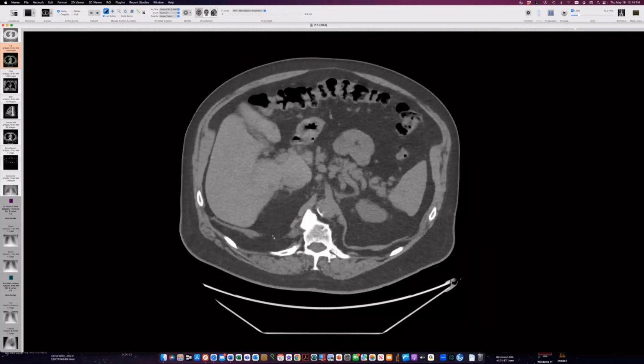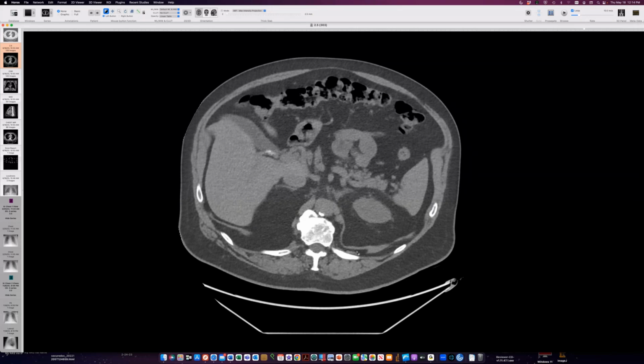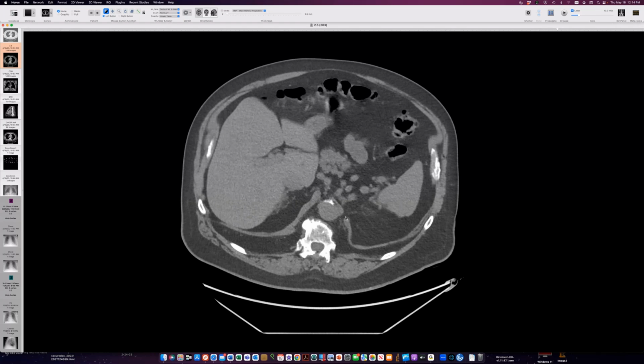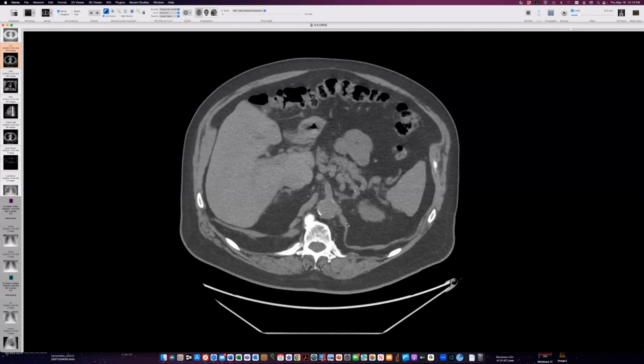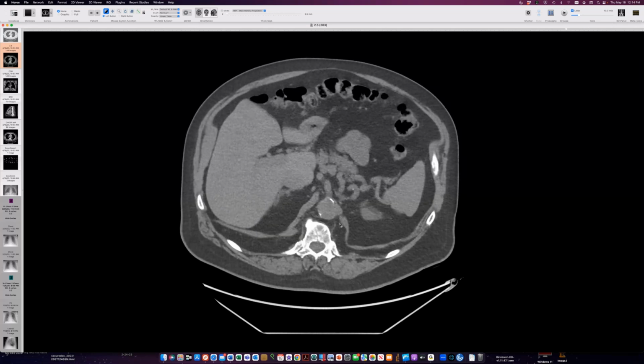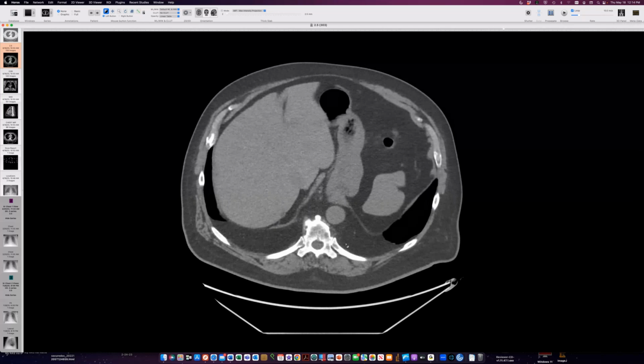You can see the discontinuity in the posterior hemidiaphragm here, and fat has emerged. And I presume that it has ruptured through the parietal pleura on top of the diaphragm on the thoracic side. It's probably just popped through and it's now oozed out, and it's probably free in the pleural space. And that's happened on both sides. The defect on this side is much smaller. It's medial here, very small, but you can see vessels going through that on some levels here. You can see vessels crossing that little defect. Here's a vessel right here that goes through that defect, and then into the fat behind. So we have fat that appears to be in pleural space on both sides.